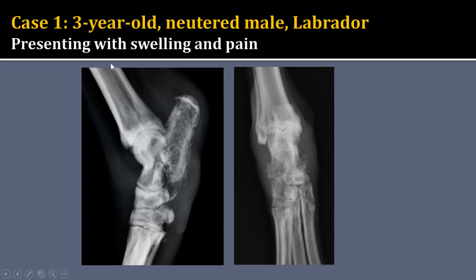Then after that, I like to look at the osseous structure starting from proximal to distal. And I had talked about looking at the cortex, both the periosteal and the endosteal surface, looking at the medullary region, looking at the periarticular areas, as well as the subchondral and articular cartilage regions, and then just continuing on down. I really am seeing my predominant abnormality affecting the calcaneus here.